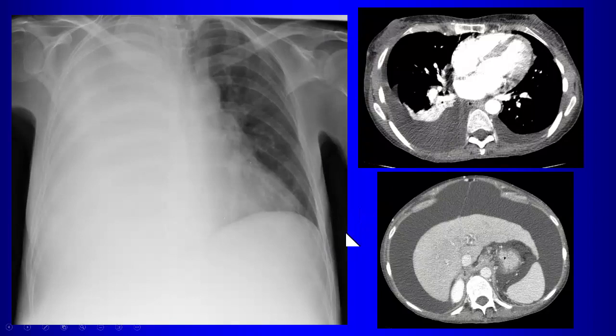What's your diagnosis? There is cirrhosis. There is ascites. What do we call it if a patient has a large pleural effusion? This is hepatic hydrothorax, right. So it's a patient with a large amount of ascites and cirrhosis. So this patient has hepatic hydrothorax. That's something we see quite a bit of around here. It's a liver center, a lot of cirrhotic patients, okay?